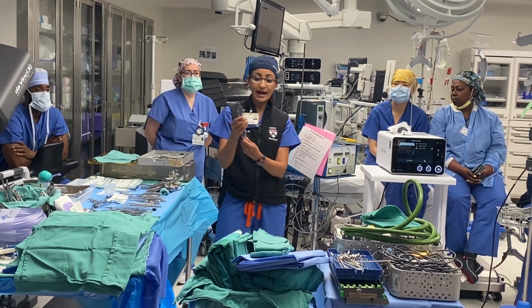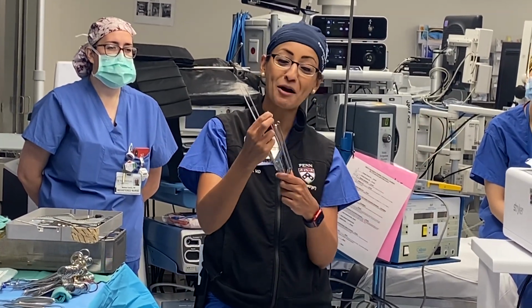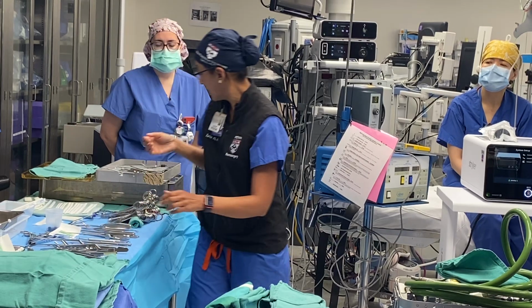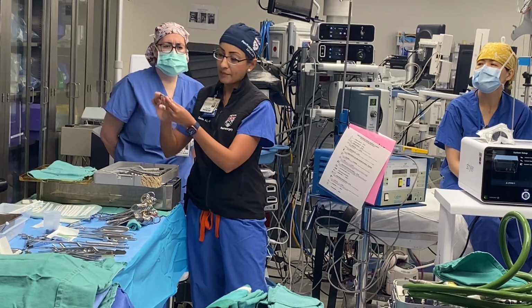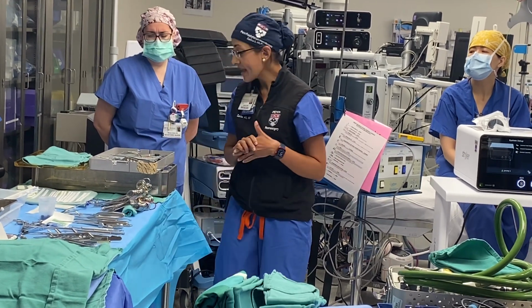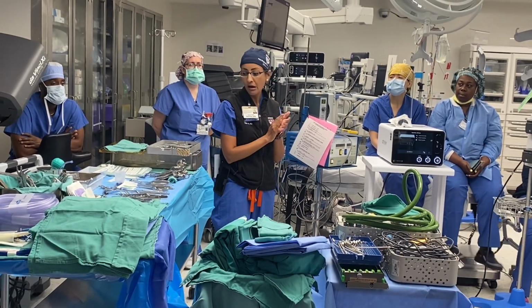These are the tumor graspers on the Crani set. There's a really small one, a medium one, and then we call this Big Bertha. I don't know what it's actually called, but whatever. Depending on the size of our lesion, these are the tumor graspers that we'll use. Sometimes we'll also use the micro pituitary on this set, and a micro tumor grasper on this set. A lot of that tedious work is done under a microscope, as you all see us do.